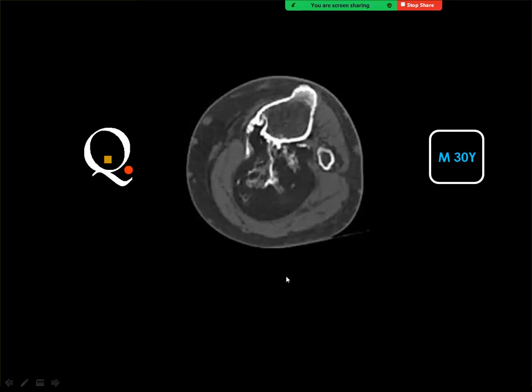Yeah, you remember from the lectures of soft tissue tumors that paraosteal lipoma is a mass of fat tissue that is adherent to the bone, and because of its intimate relation to the cortex of the bone, it will initiate some sort of bone reaction, and this bone reaction will appear as bony strands going through the lipoma itself.